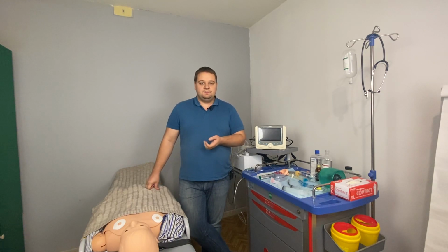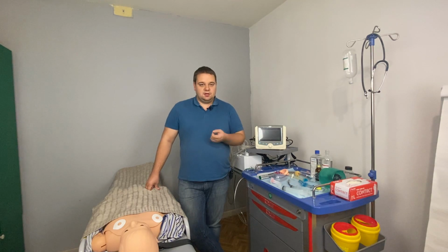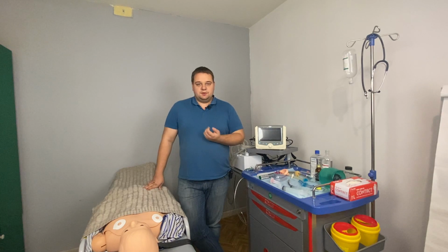When we talk about airway management, we have to recall some history of the process. First of all, intubation of the trachea was developed after World War II. They realized that many patients undergoing severe procedures have some loss of consciousness, coma and respiratory problems, and that's why we had to invent something. There are two basic problems which were discovered.